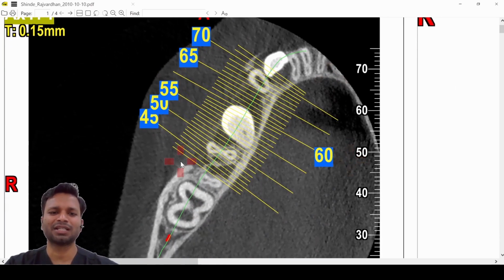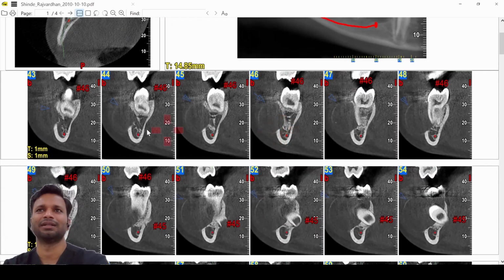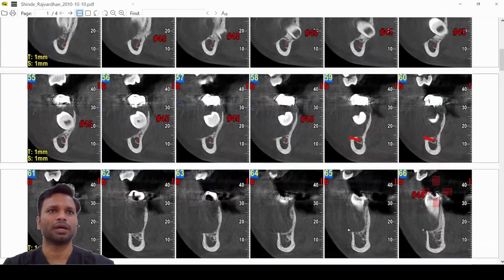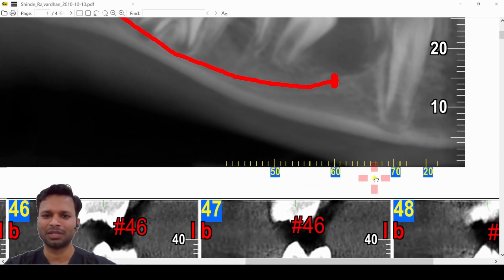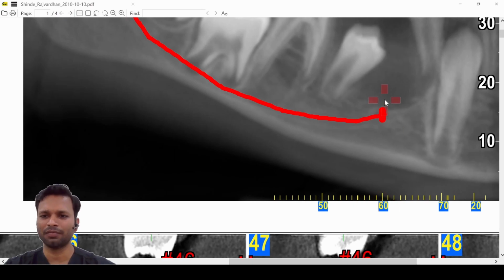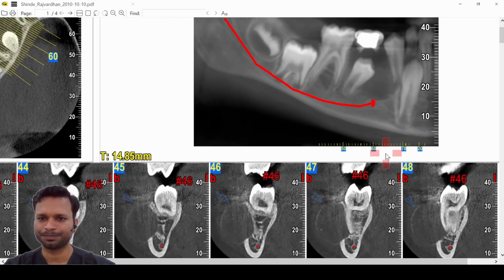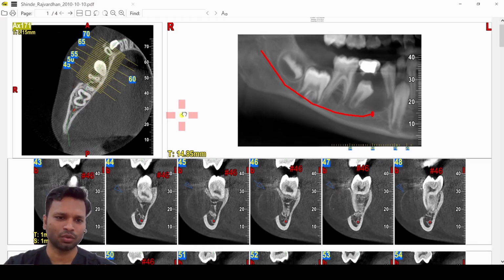So basically it is denoting that we have slices in these regions. ये जो lines draw हैं वहाँ पे slices ली गई हैं and they are printed here. So can you see 43 to 72? Okay, so again उसका एक OPG panoramic view भी बनाते हैं and the same thing is visible here. यहाँ पे 43 to 72. Okay, anyways, so 43 से देखना शुरू करेंगे.